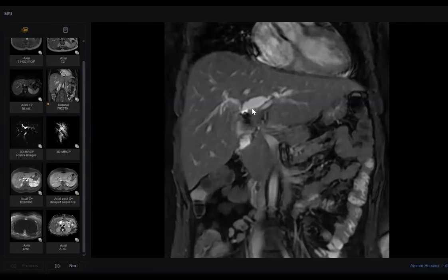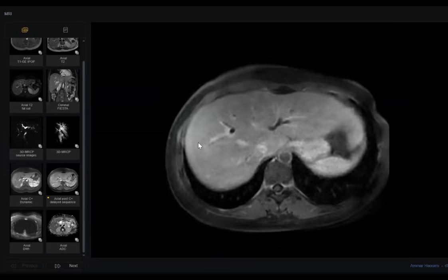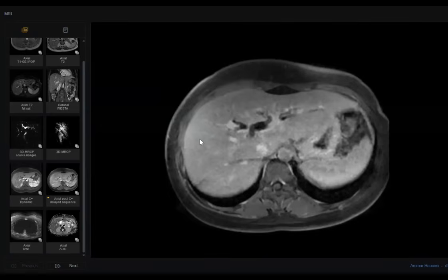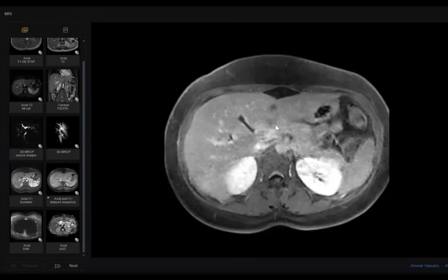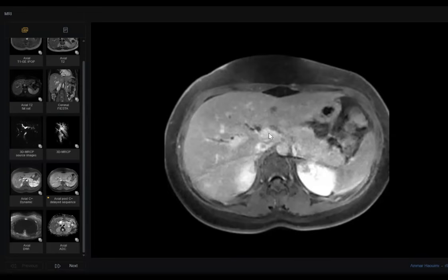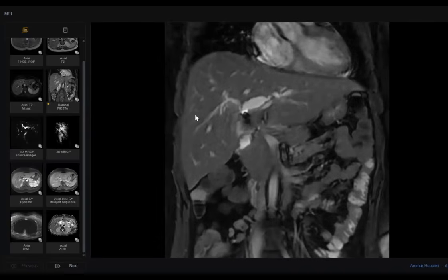Post-operative. And there is no hypodense filling defect showing at all in the post-contrast. Nothing here. See, this is the left, this is the right. This is the confluence area. Nothing here. So what's coming to your mind? So could be post-operative scarring.